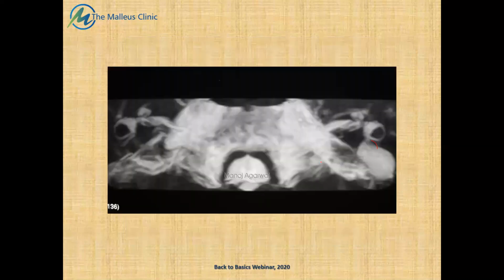So these are a few cases of enlarged endolymphatic sac. The purpose here is not to discuss enlargement of the endolymphatic sac. I presume you had a wonderful lecture from Dr. Gada a few weeks ago on this topic. Naturally, the patient profile would be much different. A patient with an enlarged endolymphatic sac would present during early infancy or childhood, whereas this was a 41-year-old patient.